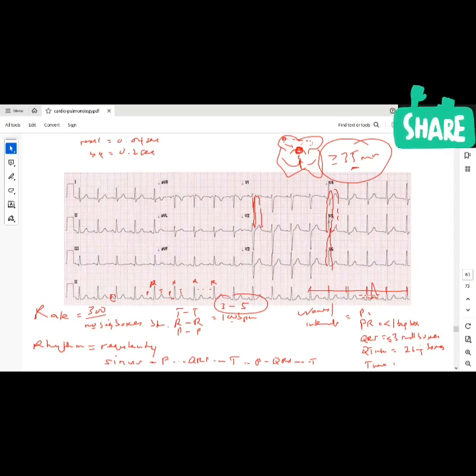And of course, remember our J point, ischemic changes, elevated or flat, things like that. But this is just a quick read on ECG, right? That you can do. Always start with your rate, your rhythm, look at your waves and intervals. As you're doing that, you're looking at your J point. Then you're looking at the height of the P wave, the T wave, the QRS complex, to figure out if there's some sort of hypertrophy in the heart or not.